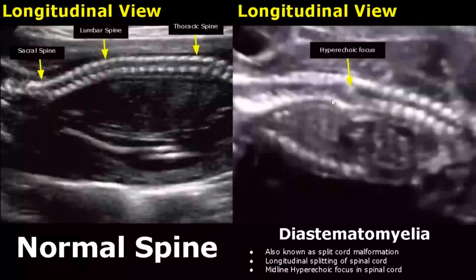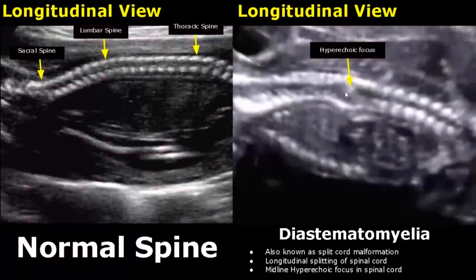Here is a longitudinal view of diastematomyelia. There is a hyperechoic focus seen in the midline.